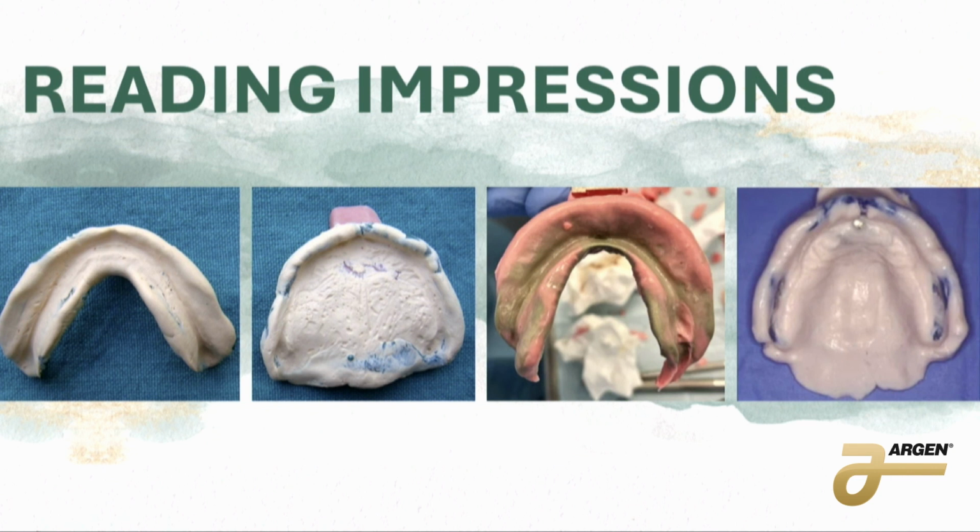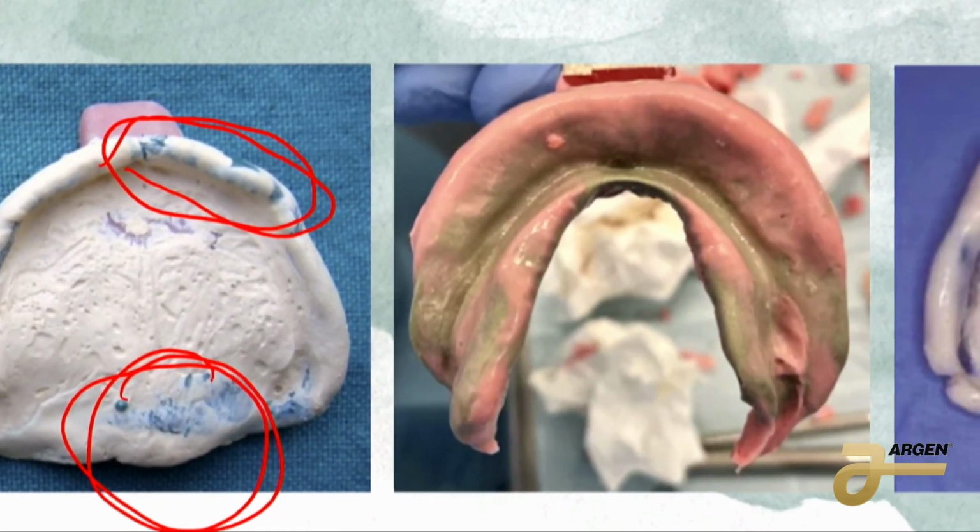You can see a lot of this has some porosity in it. It's really, really tight here. It's kind of low hanging. You can see here they have some pressure points. So this is probably not going to give you a really good accurate representation of how your patient is going to be moving and functioning, right? This one here, I think we can zoom in. Oh, nice. Look at that.